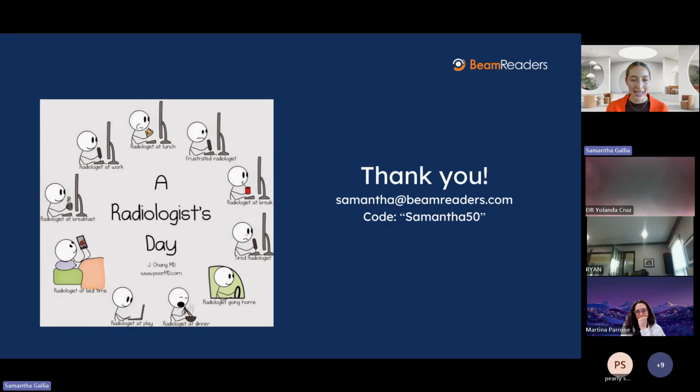So another question popped into my mind that somebody asked earlier, and it was how I generally review scans. I'm going to give a really quick overview so I don't miss that question. Obviously, it's a long-winded answer to say every single piece of anatomy as you scroll through.